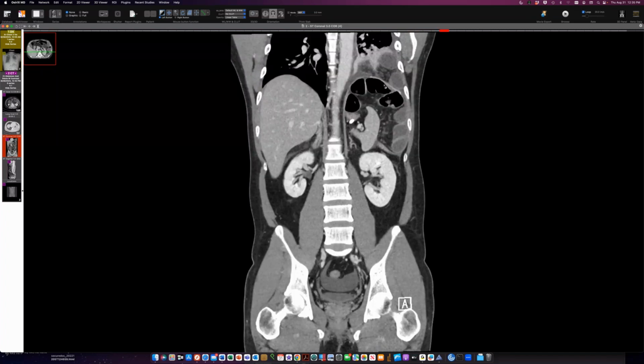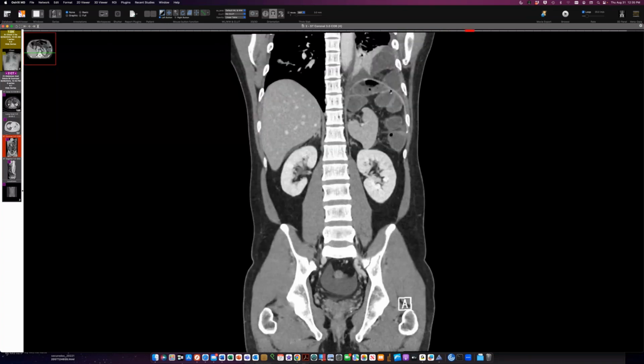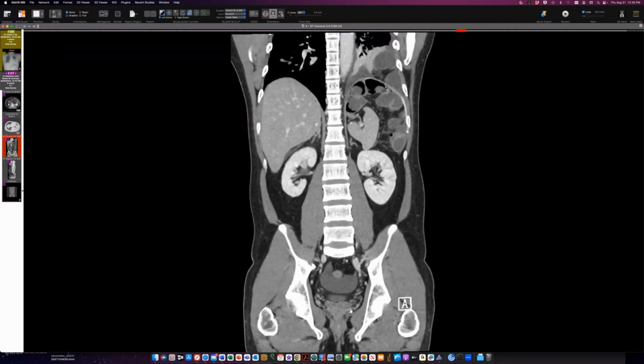So we have this density here. So we have this disrupted mesh graft from a previous repair. Now I was looking through the notes, and people were operating. They operated on this person very quickly because this person was very compromised because of the small bowel obstruction.